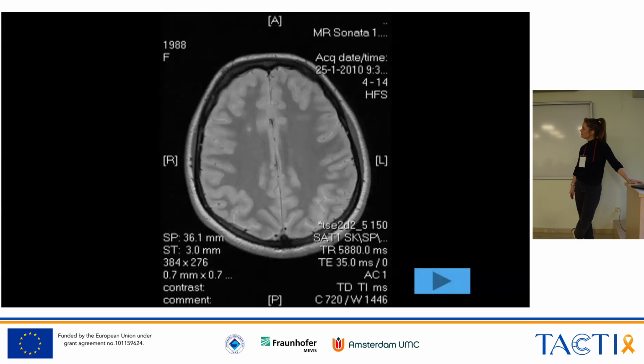And the thing is that you can ask yourself, if you only have this slice, if it's in the location that you want to see it. Perhaps you can. Yeah, we still don't know if it touches the ventricle, so if it's a periventricular lesion or not. It could still be a deep white matter lesion, and that means it has a high chance to be a aspecific or a vascular lesion. Yeah.